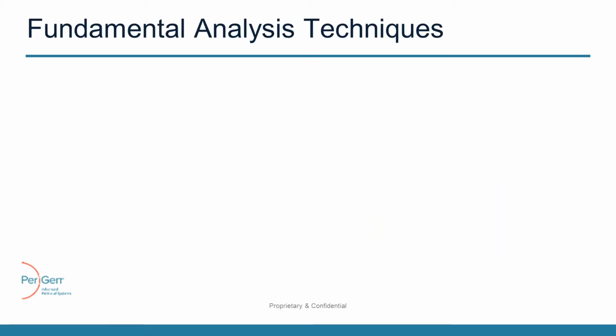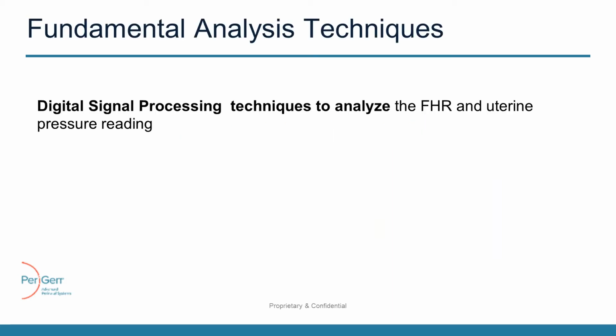We use digital signal processing techniques to analyze the tracing. We find with these techniques regions that are flat. We find bumps, which could be potentially accels or decels, and measure various features of them.